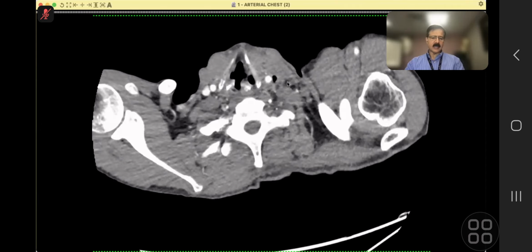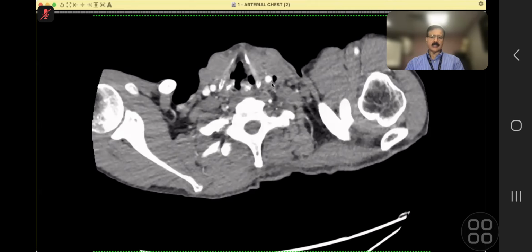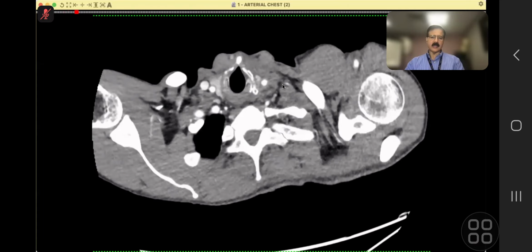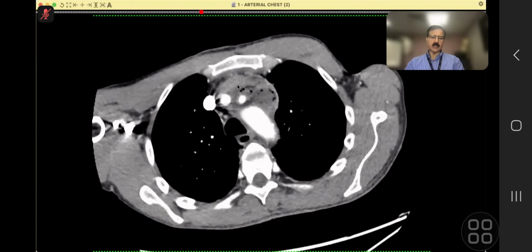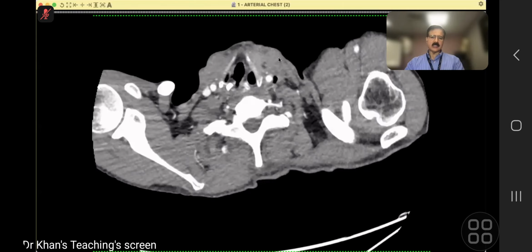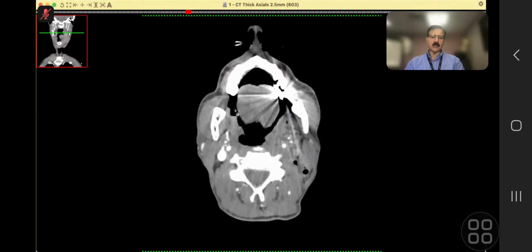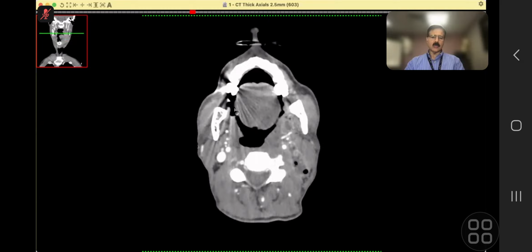And you can then ask for the next investigation, which of course was a CT in this acute context. And then you look carefully, and the jugular vein is thrombosed. It's long-standing thrombosis. Now, the left brachiocephalic is not opacified, which makes sense. As soon as we pick this up, we go for something upstairs. Now, first of all, think out of the box. What's happening? It's a transspatial thing.